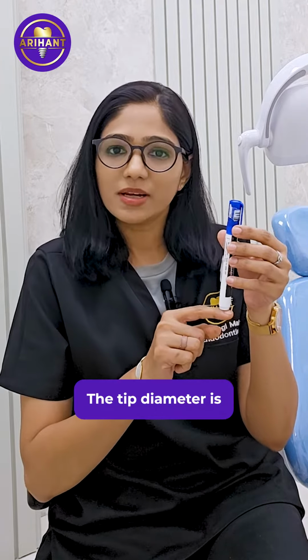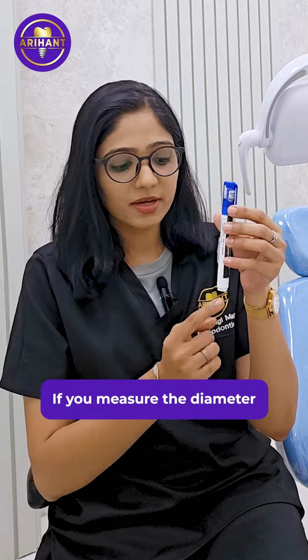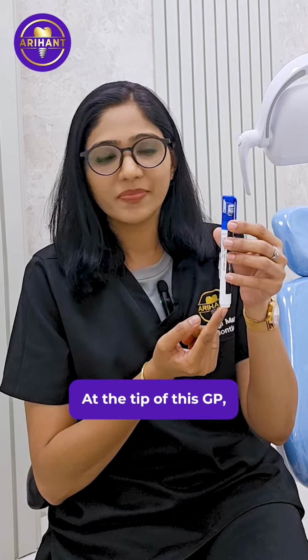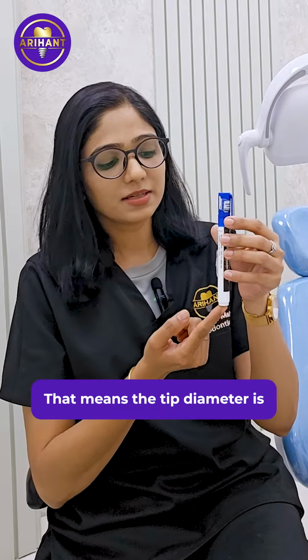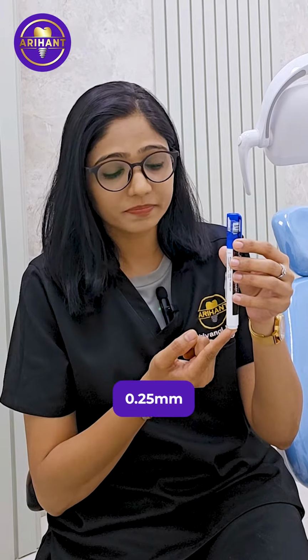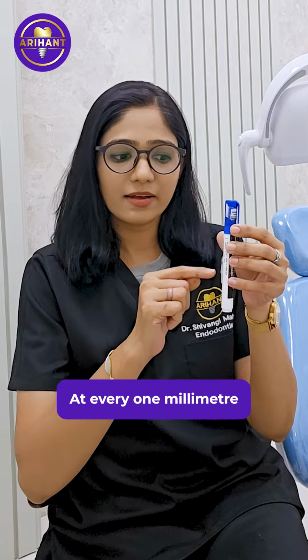For example, this is a GP point. It is a number 20 GP point. That means the tip diameter is 0.2 millimeters. If you measure the diameter at the tip of this GP, it is 0.2 millimeters. If it was a number 25 GP, that means the tip diameter is 0.25 mm. Now the taper just means the increase in diameter at every 1 millimeter of this instrument or this GP.